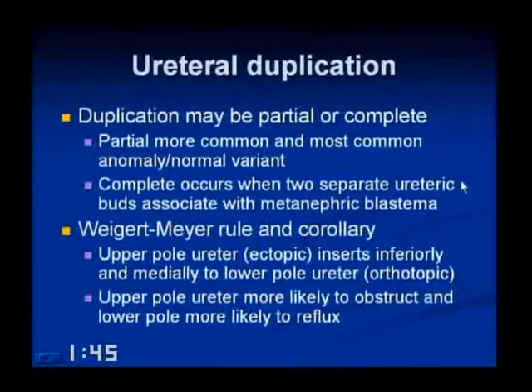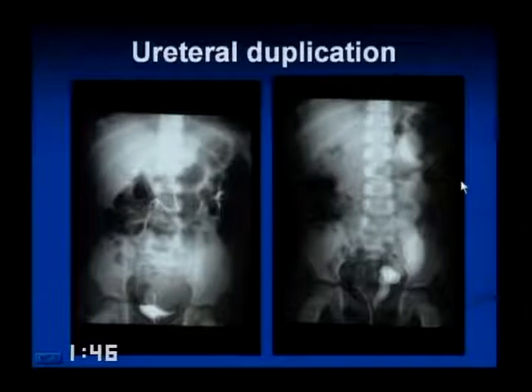Okay. This is on your left an excretory urogram, and on your right is a delayed image from the same study. And since we don't see these very often and they are boards material, I just would like to review this with you briefly. The right kidney is normal. The upper pole calyces should be aimed towards the contralateral shoulder. The ureter usually sweeps past the transverse processes, and the calyces are delicate.